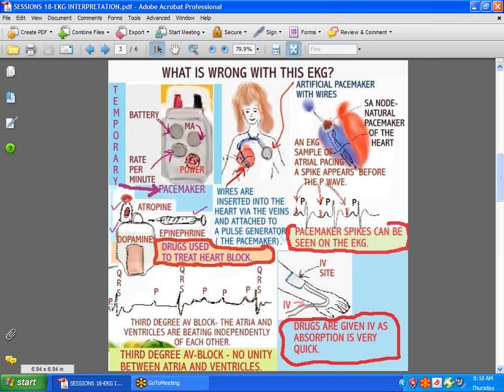You might find a P wave coming in the normal place in front of the QRS, or it might come after the QRS. There might be a P wave that does not follow with no QRS following. Here's a QRS, there's a P here, there's a P. There is no QRS here following the P, a P, QRS, a P wave.